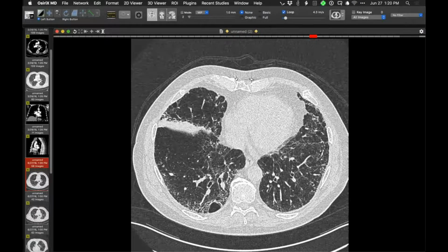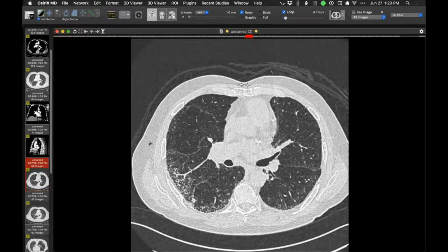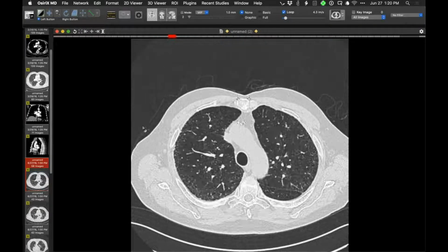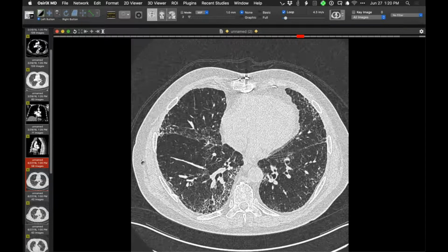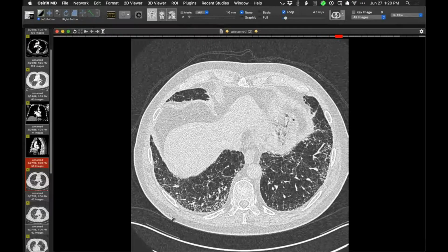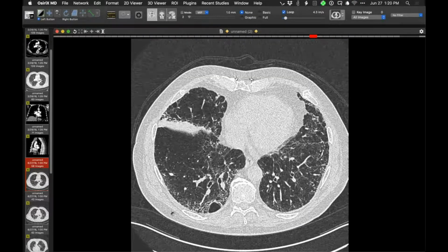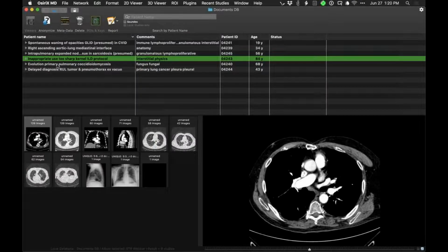What do you guys think? Do you see this? I'm sure you probably see this. Absolutely. Agree, Howard. And we see it with the GE scanners where they use the lung kernel, which is designed for thicker cuts, not thin section. And unfortunately, the naming convention is sort of a problem. But yeah, I've seen this with the Siemens one too. I agree, 70's even a little high for me. Yeah, it's a nice example of an inappropriate kernel.